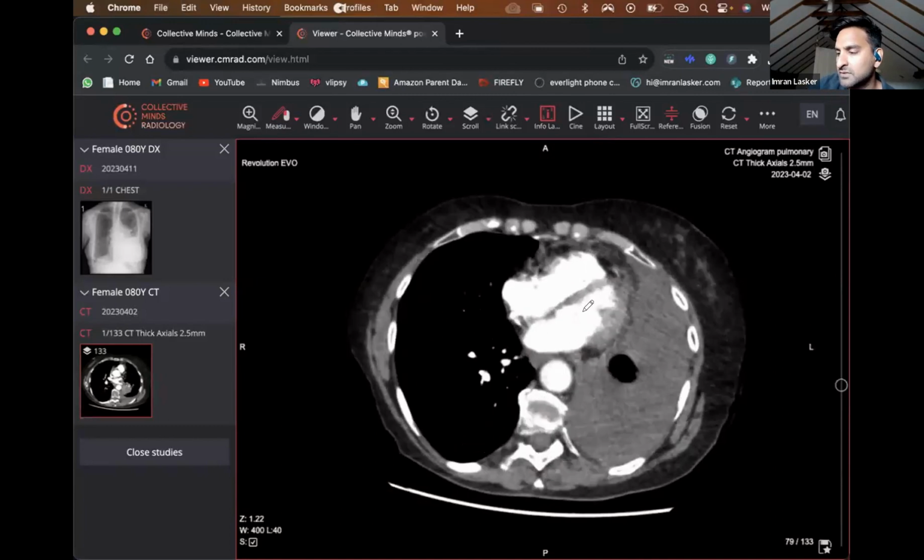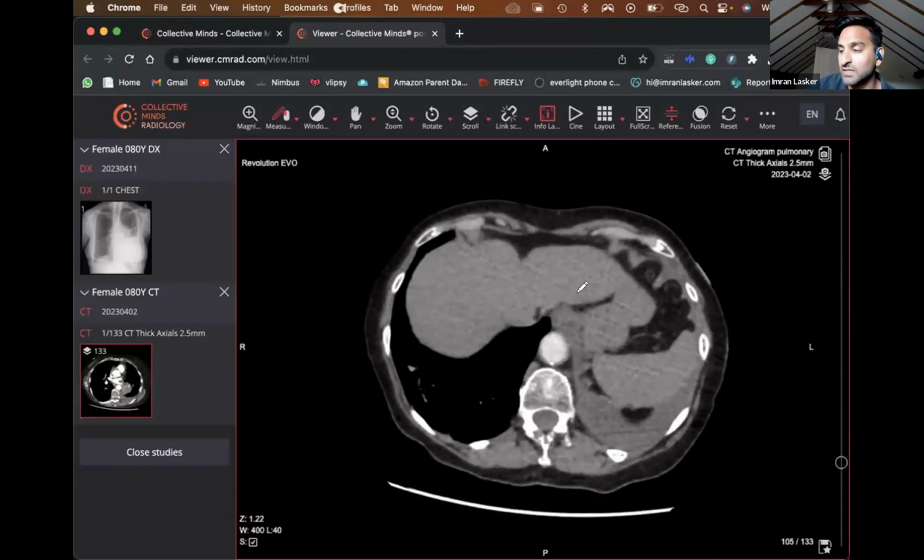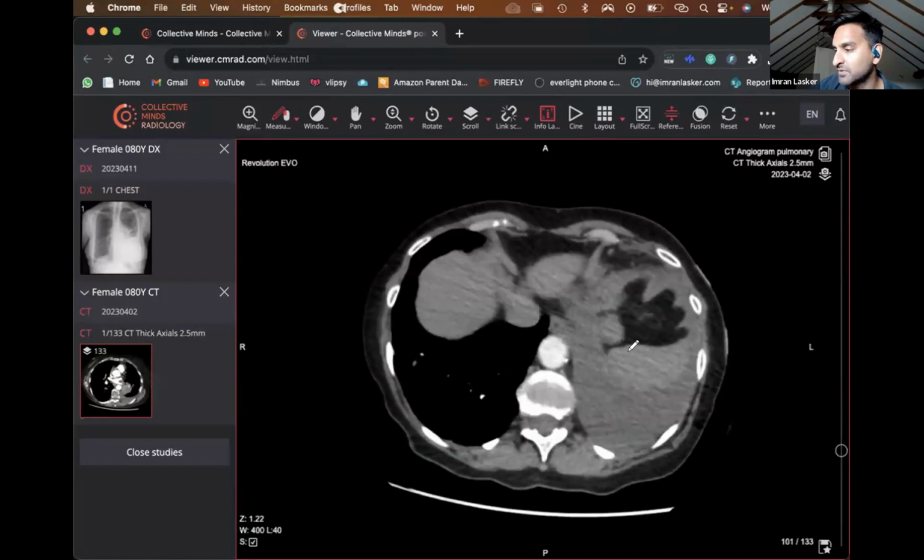So you could either get hypervascular lesions, or lesions that are not best seen on the portovenous phase. In some of the places I've worked, when they do the staging scans, they do arterial phase all the way through to the upper diaphragm to make sure they get the liver in case there's an arterially enhancing lesion. And then they'll do a portovenous phase doing the abdomen again from the very top.